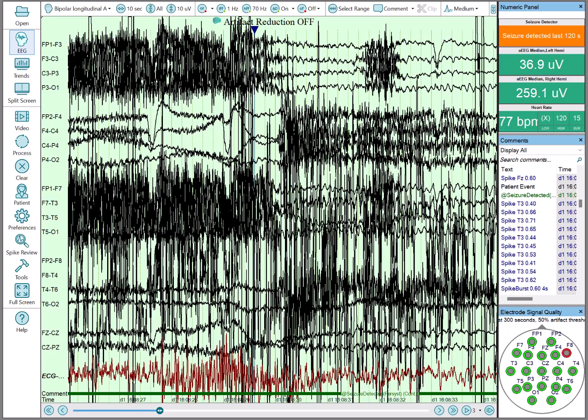that. Asymmetry spectrograms, we want to set notifications for that because symmetry shouldn't normally change during state changes, so we can use that to help notify us of changes in symmetry on a statistical basis. And we'll also look at electrode signal quality. These are all things that have multiple values that we may want to distill into a single value so that we can create a numeric display and a notification for that.